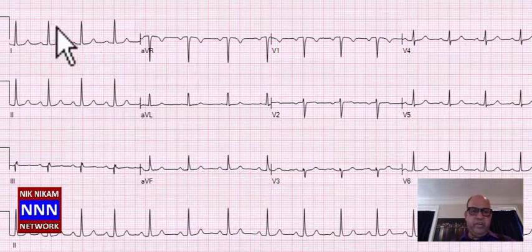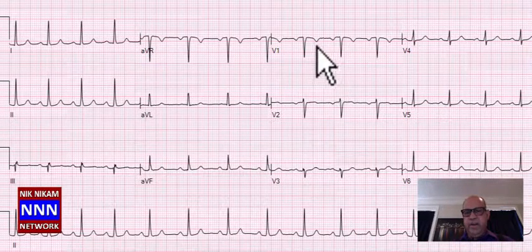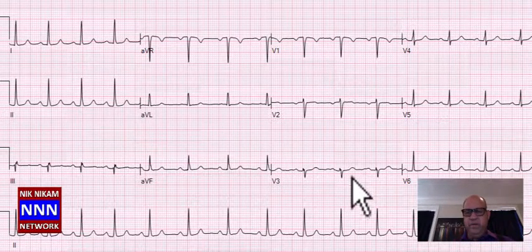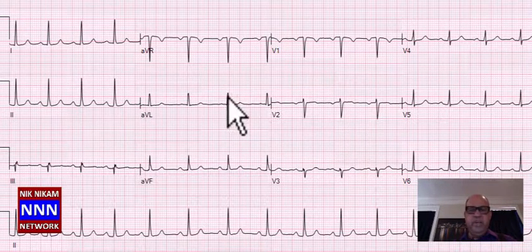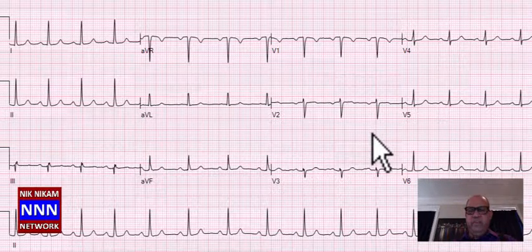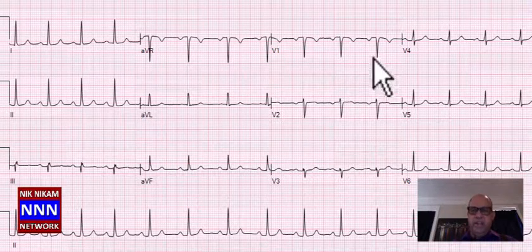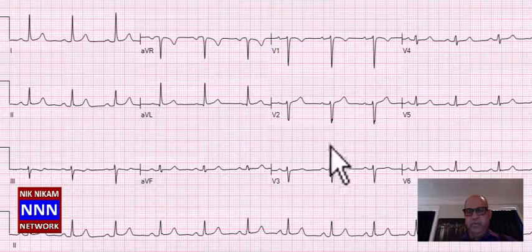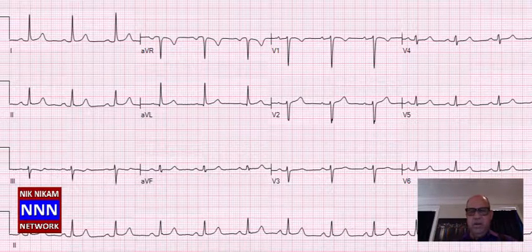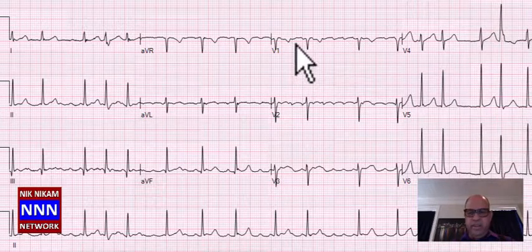Here's the next electrocardiogram. Sinus rhythm, 1 and AVL look okay, inferior leads 2, 3, AVF all right, anterior leads, left atrial enlargement, little poor R-wave progression, but the rest of the electrocardiogram looks normal. So I would just say sinus rhythm with left atrial enlargement with possible lack of R-wave progression in the anterior leads, which may be related to lead placement. Sinus rhythm, high anterior looks okay, inferior looks okay, anterior wall looks okay, and the lateral wall, pretty much normal electrocardiogram.